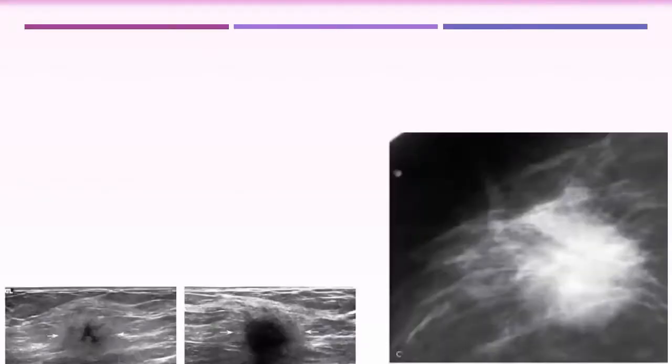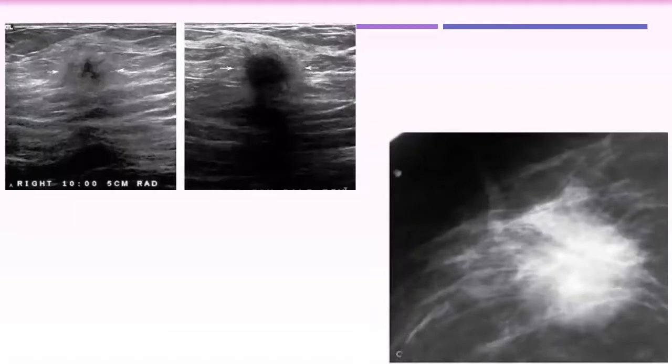Okay. What about this lesion? Continue. This is spot magnification, it came to you, showing a high density, irregular, spiculated mass. On ultrasound, it appeared hypoechoic with a thick rim. This is the first image; one is the first, one is a follow-up.